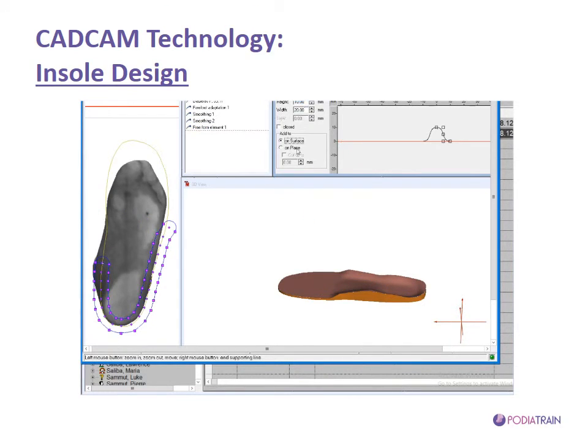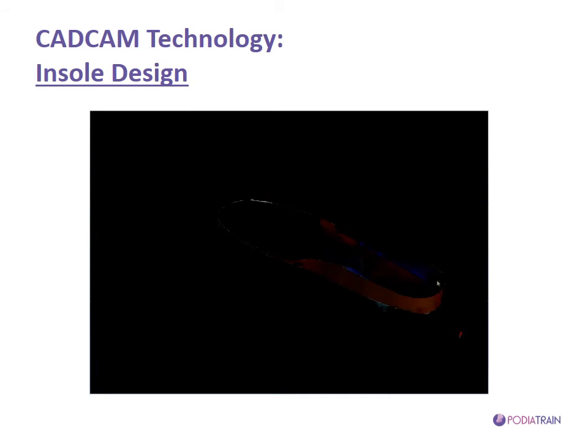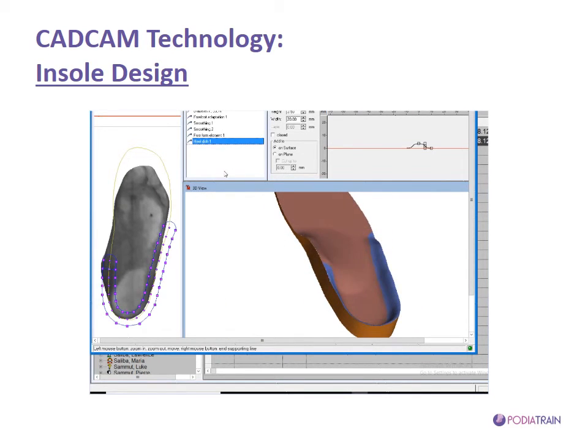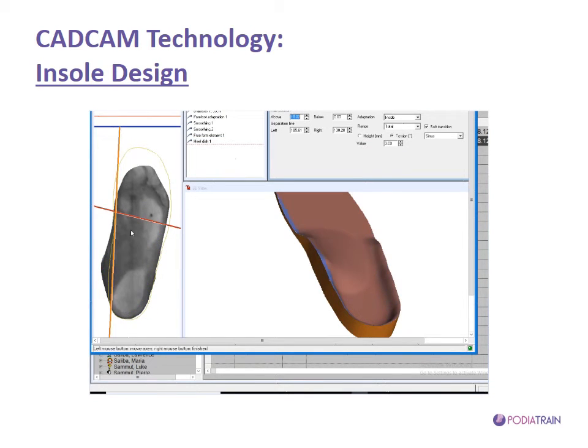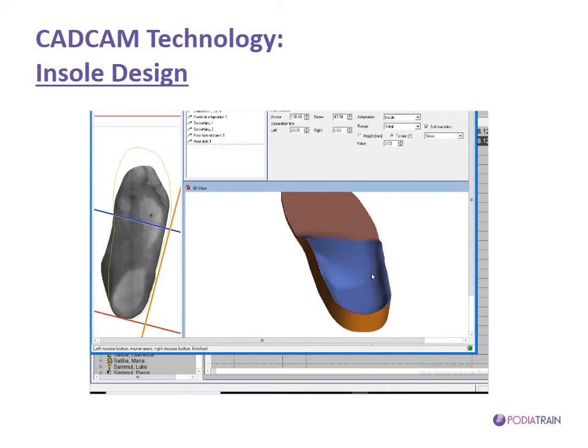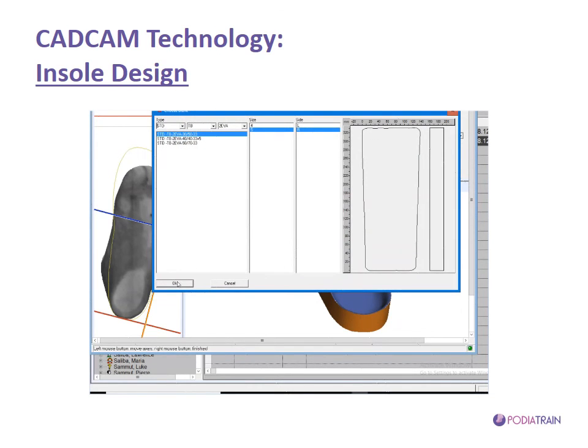Again, a heel dish would be really important here. So with the heel dish finished, again, now we can see the smooth appearance of the insole. Okay, so next thing I will do is insert a small correction, a small medial wedge or post on the hind foot, starting from proximal to the metatarsophalangeal joints back to the midfoot, in order to try to limit as much as possible the pronation that this patient exhibits.